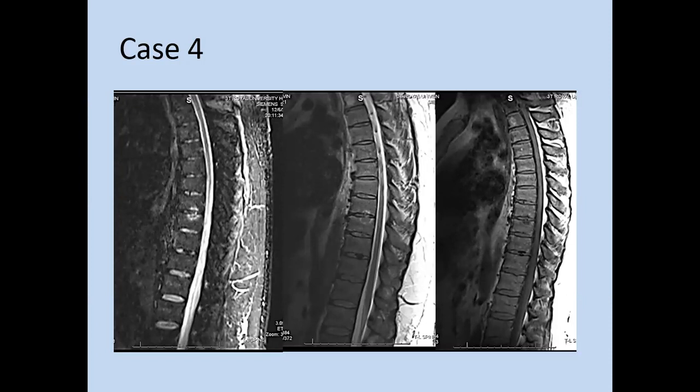The shapes of the vertebral bodies look normal. There is no bridging ossification across the anterior aspect of the vertebral bodies, with normal interspinous and supraspinous ligaments, and normal spinal canal and spinal cord signal intensity. Features most likely in keeping with an Andersson lesion, with abnormal signal intensity within the intervertebral disc and the adjacent end plates. Perfect. That's very good, actually. It's an Andersson lesion involving the intervertebral disc, and what we see here is the end plate edema.